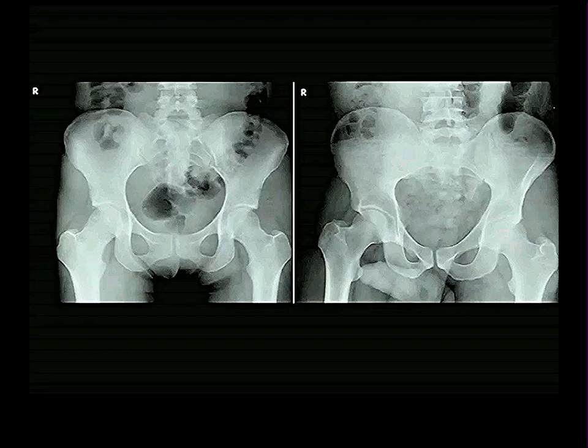One of these is a bony pelvis of a female. The other is a plain film of a male. It's a 50-50 chance. Which do you think it is? Yeah, I'll go with the left. The left is a female. You are 100% correct. Why do you say that?